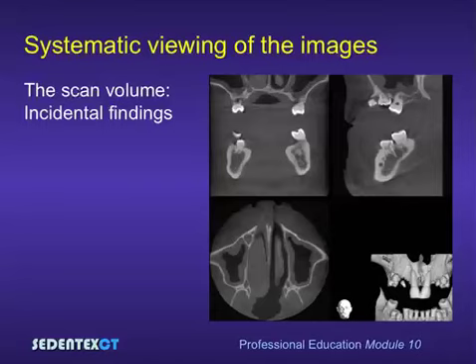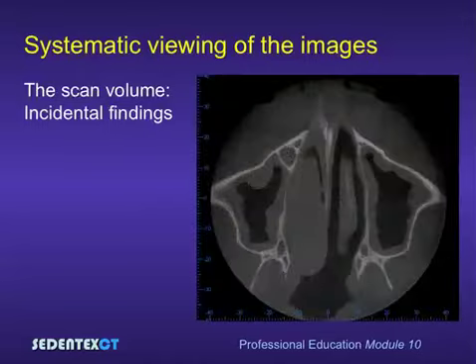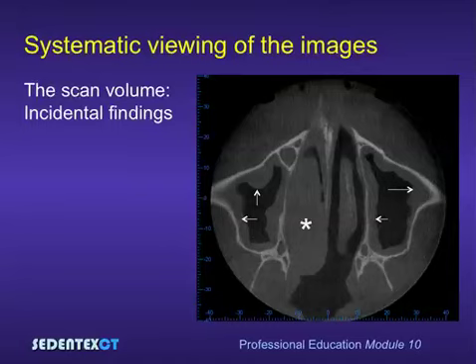You will find when conducting cone beam CT examinations of the upper jaw that you will encounter inflammatory changes in the maxillary sinus and nose quite commonly. If we look at a close-up of the axial scan of this patient, you can see the black areas in the center of the maxillary antrum lined with a grey area bordering the walls of the antrum, which represents mucosal thickening. This indicates chronic sinusitis. Note also in the right nasal cavity there is mucosal thickening overlying the inferior nasal concha, indicating inflammatory disease here as well.